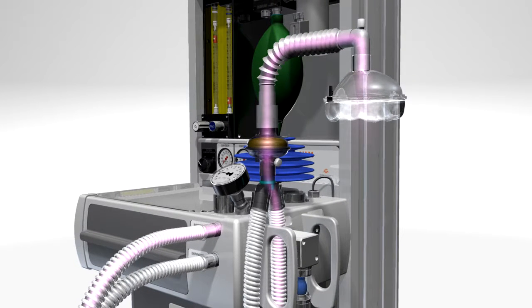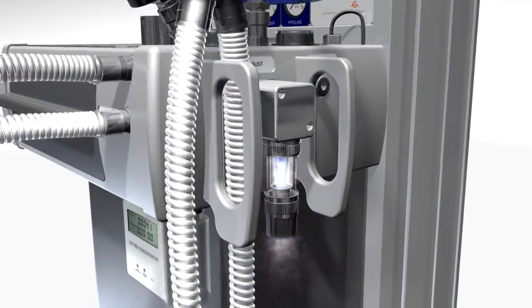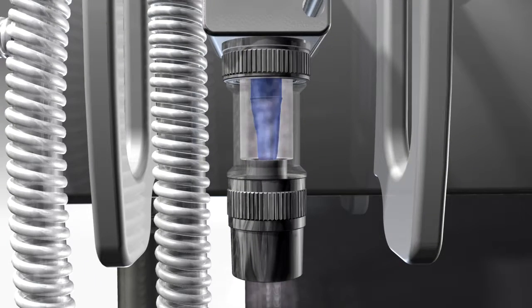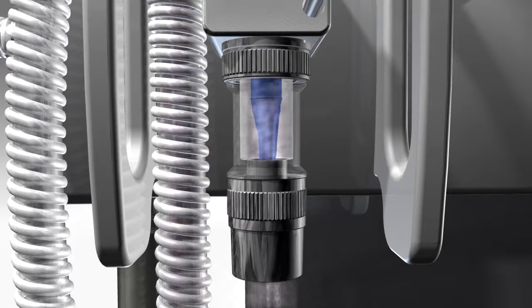The expiratory limb of the Y-piece channels gas to an inflating valve on the UAM that functions like an AMBU valve. It uses a balloon made from long-lasting silicone which closes during inspiration to direct gas into the lungs. During expiration, the balloon empties and opens the exit port, allowing exhaled breath to flow out through a final one-way valve and on to a scavenging device.